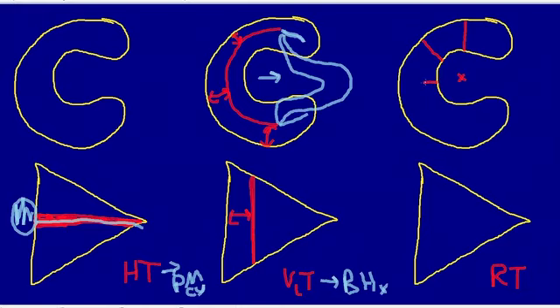I could create a partial radial tear here. I'm going to create a partial radial tear here. And now I'm going to create a full radial tear here. And sometimes these radial tears can have some width to them, so here I'll create a radial tear that has some girth to it. Now, radial tears, because of how they're looking in the axial plane, can take on varying appearances in your coronal and sagittal planes based on how you're cutting the tears.